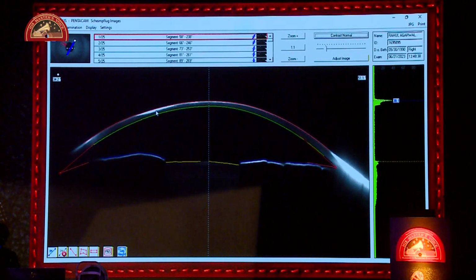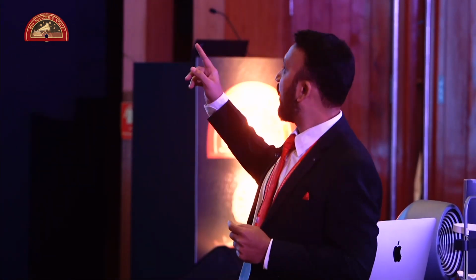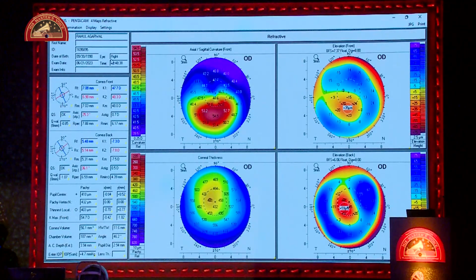The problem is not about ectasia. The problem is that the scar has flattened the cornea. Next to the scar, there is a relative steepening. What we are seeing is not actually the ectasia. We are seeing the effect of flattening from the scar just above that. Now, can we go back to the 4 map, please? Interestingly, if you look at the thinnest pachy, Sneha, can you show me the thinnest area of pachy down there? That's not correlating with the curvature map or elevation map, nothing. So the thinnest pachy is not in that area.